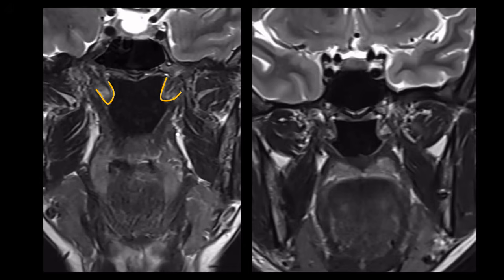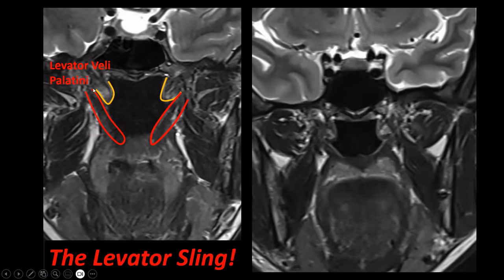So here we have the Torus Tubarius of the nasopharynx. This is the Levator veli palatini muscle, which you remember from the presentation on nasopharyngeal anatomy. And here we see the soft palate. This is another patient. And we see that the Levator veli palatini muscles form some kind of sling. So when they contract, they will elevate the soft palate.